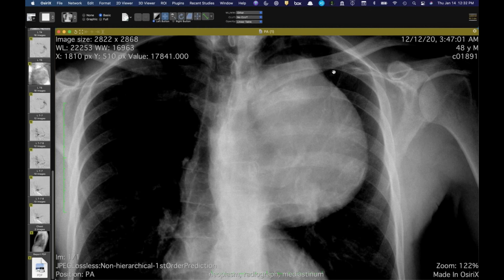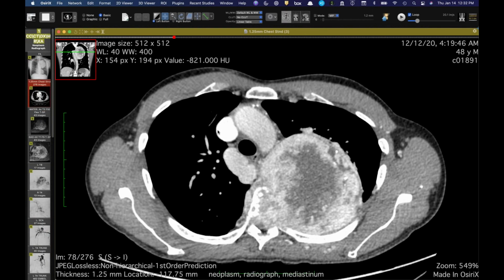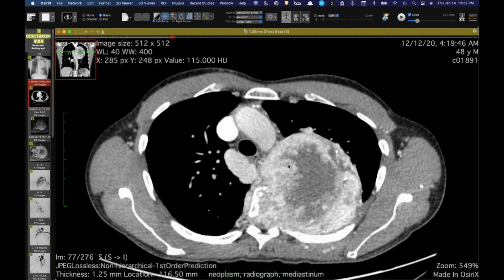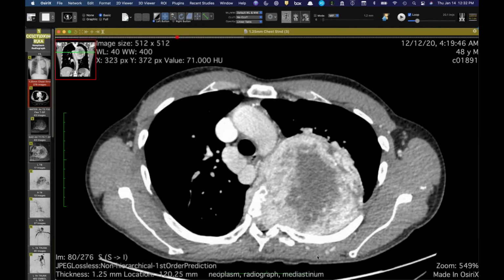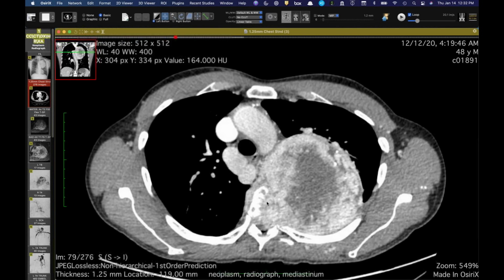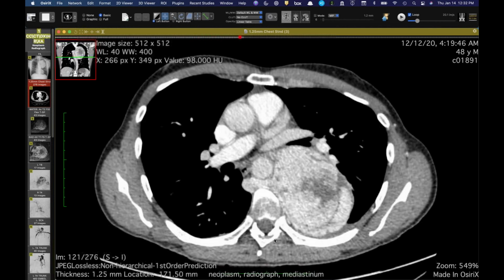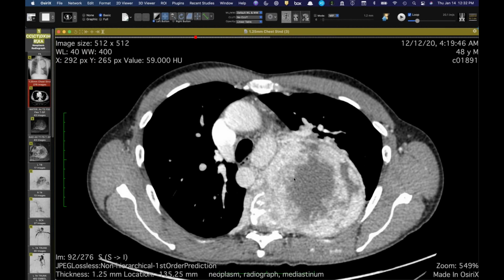And I don't know if I can window it. That is the anti-cervicothoracic sign. In other words, and correct me if I'm wrong, if we're seeing a well-defined interface between the superior part of this opacity and the lung, then that is the non-cervicothoracic sign. I never remember which one's which, but the idea is, you have a complete margin up here, so it's probably not anterior. Right. Yeah. And then if you look at the vertebral bodies, you see there are at least a couple of levels where you don't really see much.